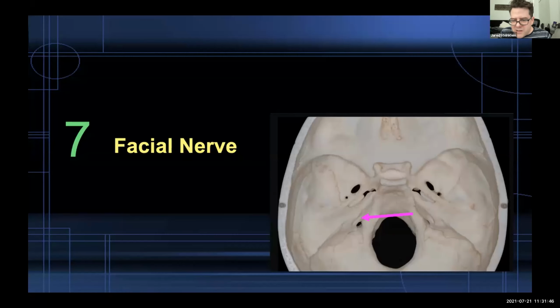All right, 7. So you're going to have to imagine, but the internal auditory canals are coming out almost perpendicular to the bird's eye view here, but those are on both sides tucked away, going through that petrous apex, the triangle portion of the really dense bone part of the skull base posteriorly.